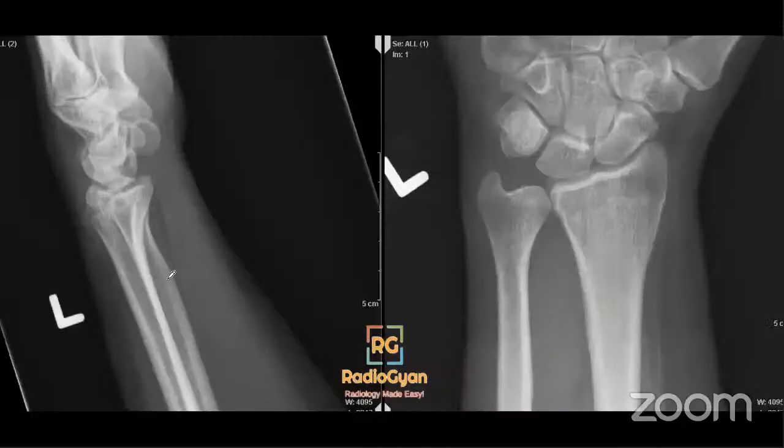So this is the follow-up radiograph, and you see the distal radius fracture is seen better here. So always in patients with trauma and wrist radiographs, if the patient has symptoms, it's always a good idea to do follow-up radiographs, because initial radiographs can often be negative. And this is very important in cases of scaphoid fractures, because they can eventually cause osteonecrosis.